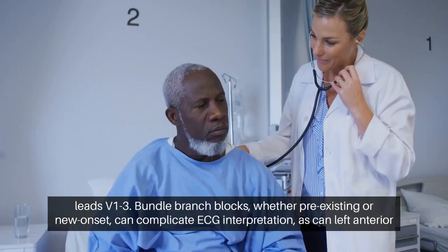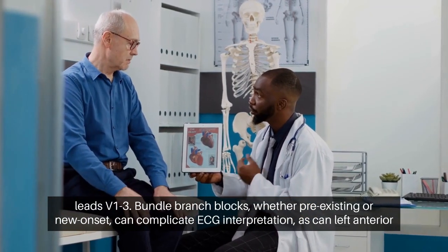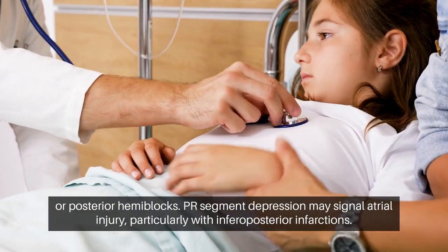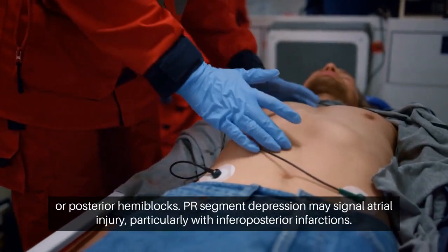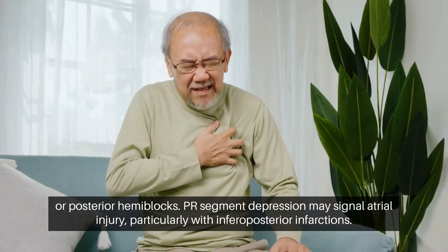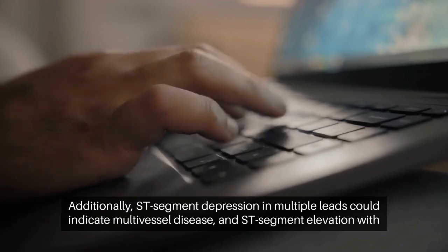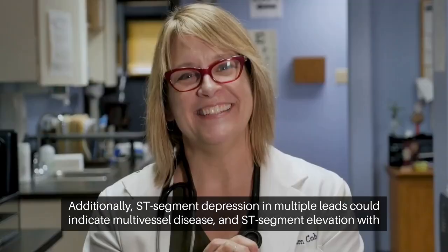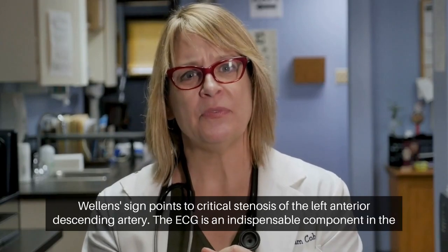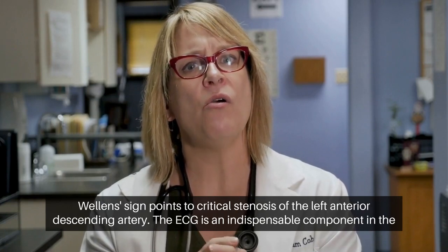Bundle branch blocks, whether pre-existing or new onset, can complicate ECG interpretation, as can left anterior or posterior hemiblocks. PR segment depression may signal atrial injury, particularly with inferoposterior infarctions. Additionally, ST segment depression in multiple leads could indicate multivessel disease, and ST segment elevation with Wellens's sign points to critical stenosis of the left anterior descending artery.